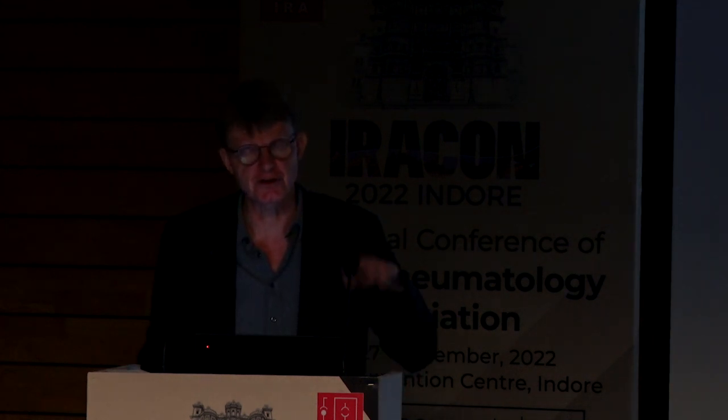I would like you to sit for 2 or 3 minutes to scroll through the images and get familiar with the software. Try to enlarge a bit and make it smaller, make it a little brighter and darker and that kind of stuff. Then perhaps answer the first 1 or 2 questions on the side, just so that you see it works. You shouldn't spend time on all of it. Then we'll move on to real cases afterwards.